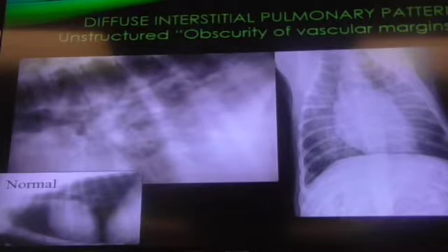For interstitial, usually it's the eosinophils that you will see in the lavage. So doing a lavage does help you with the answers. Question? So in cases like this one right here, did you say that the one in the top corner was most likely an interstitial pattern? Yeah, because the opacity is really very prominent.